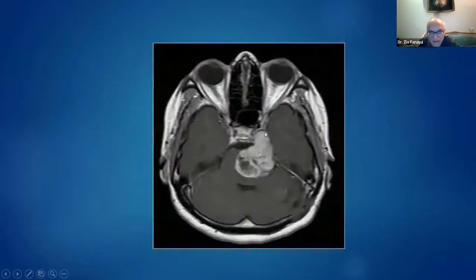And this, in contrast, is a V3 fifth nerve neuroma. So this is passing through Meckel's cave. This is inferior and lateral. Remember, there are only two things which involve two cranial fossas. So this is involving the posterior and the middle cranial fossa. So it can either be a meningioma or it can be a schwannoma. And schwannomas are more common. Plus, you can see the large cystic component as well, which you will almost never see in a meningioma. And plus, of course, you have the typical dumbbell appearance and the location within Meckel's cave.